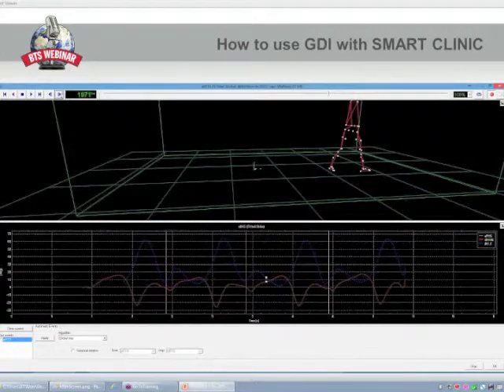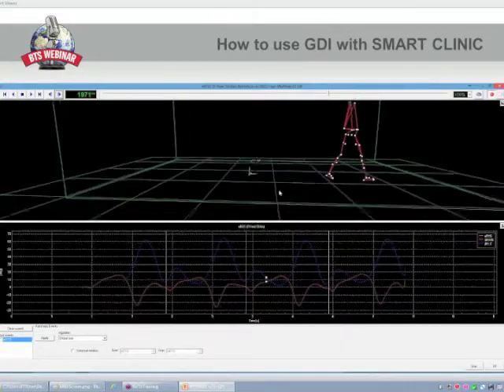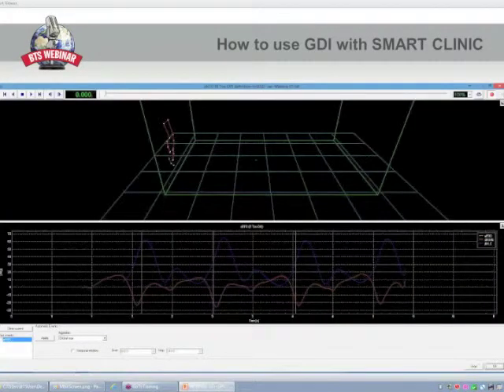This is going to be the second one. Okay, to help you in doing that, you can zoom in, look at the stick diagram, and if you have the ground reaction force, it's suggested to use the information coming from it. Now I'm going to define the event.